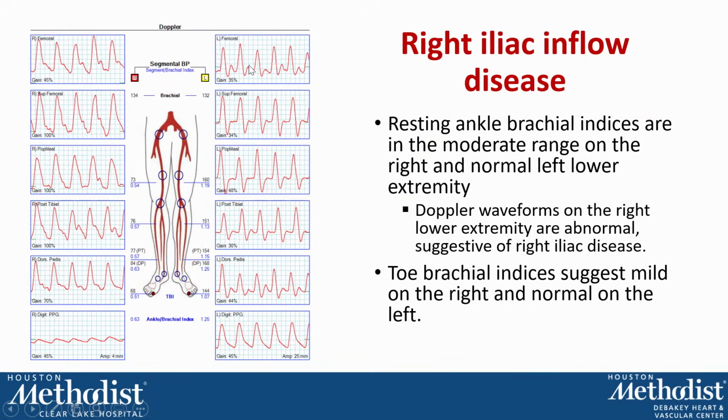Once again, let's take a look. Left side, because I see the right side, not so normal. Left side is normal, essentially. I'm looking at the waveforms: they are normal, triphasic, with normal indices, normal toe indices. Perfect. On the right side, we see that the common femoral waveform is not symmetric.